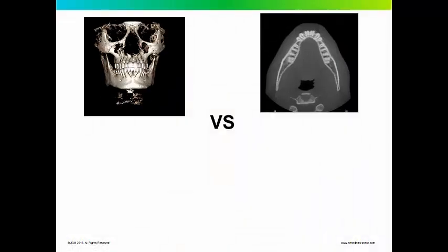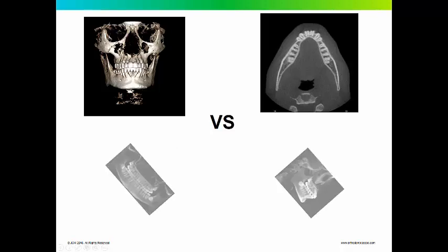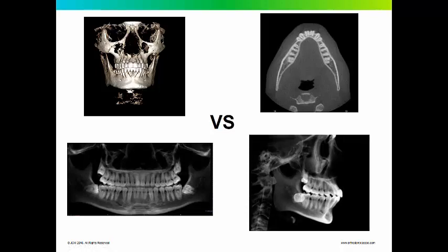Orthodontic dehiscence pattern can only be diagnosed two ways: either through cone beam CT, as in the case here, or after the patient starts to develop problems, by direct visualization through either surgery or tissue dehiscence. It cannot be diagnosed properly using a pan or cephalometric X-ray.